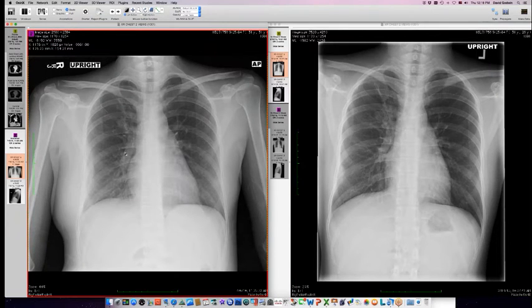chest radiograph, and here she is with, now she has chest wall pain on the right. So her right upper lobe nodule, looking like a granuloma, hasn't changed very much in these few years. It might have shrunk down a little bit. But we still have this pleural thing here. Maybe it looks a little fatter than before. Plus we have this swelling in the chest wall that wasn't there before.